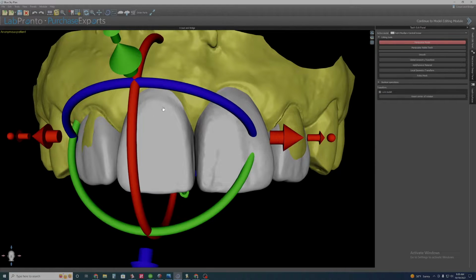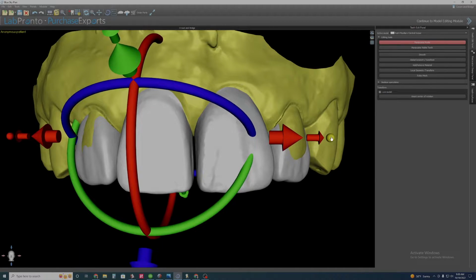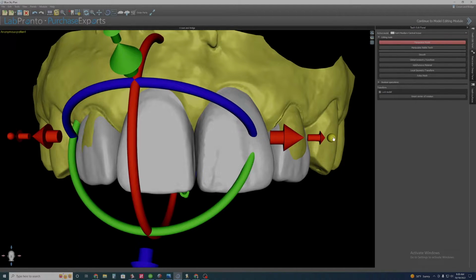manipulate the individual teeth here, and you're going to see this additional tool. It's a circle. This allows you to kind of deform things. So just to show you the example, I can shift the tooth in this dimension, and I don't want this tooth too much wider compared to the other tooth, but I do want to make contact, so I'll probably expand both sides to make sure they come in the middle without too many issues.